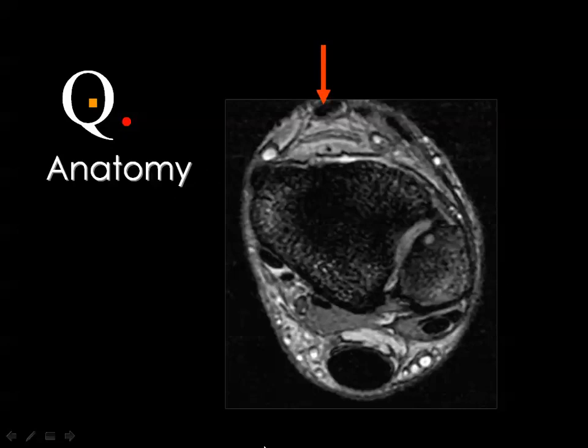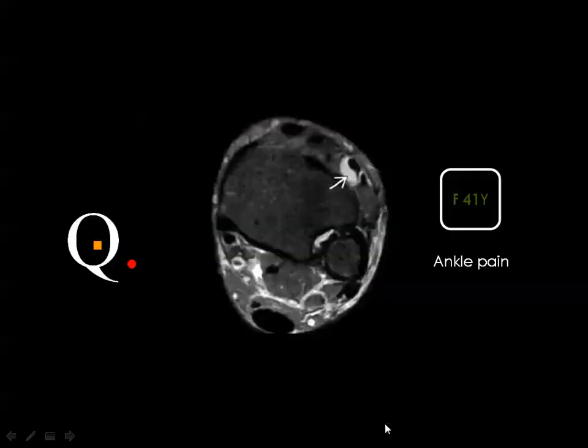Anatomy, مين التندون دوت؟ tibialis anterior، مين دوت؟ flexor hallucis اهوت، tibialis posterior اهوت، برينيس بريفس ولا لونجس؟ لا طبعا البريفس هي اللي جوه واللونجس هي اللي بره. ده برينيس بريفس دوت لونجس. مين الكرومبا دوت؟ الاكيلس تندون. مين دوت؟ اكستنسور ديجيتورم. طيب السهم ده بيشاور على ايه؟ Tenosynovitis of the extensor digitorum.